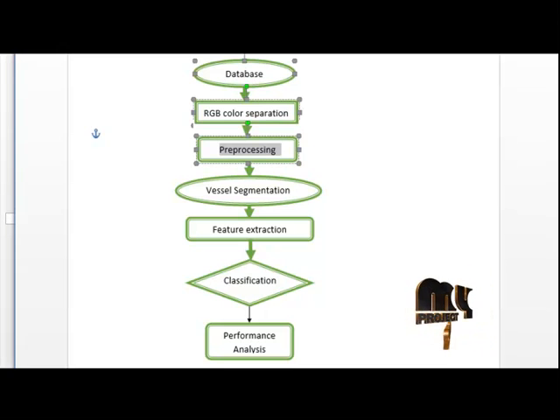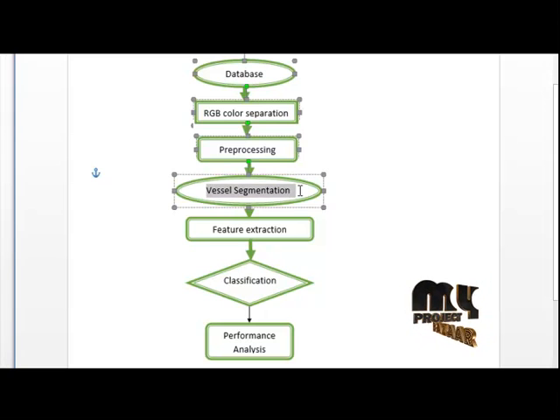Then the next step is the vessel segmentation. For vessel segmentation, here we use the graph tracing algorithm. The vessel will be segmented in the image by the use of the graph tracing algorithm. Each vessel is tracked individually by repeatedly finding the next vessel point with a scoring function that considers the pixel intensity and orientation in the vicinity of the current point in the image. Tracking for the same vessel then continues along the most likely path. Next, we model the segments as a segment graph and use constraint optimization to search for the best set of vessel trees from the graph.